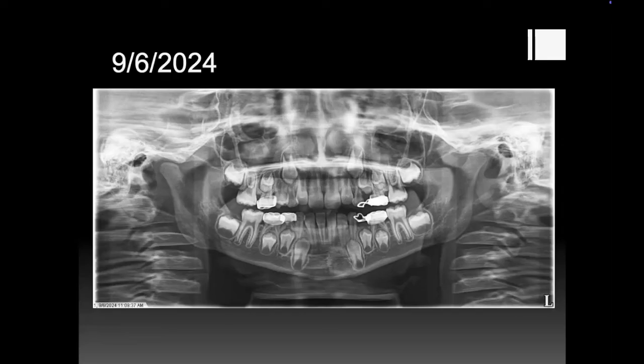The second primary molars are still there. They seem to have at least a little bit of root left. So that's good. And then we have primary canines, right? And they have a little bit of root left as well. I would have loved to have seen this patient 2 years ago and treated them then, because you would have had more solid baby tooth roots and your anchorage would be better and the resistance of the maxillary suture would be less. The older you get, the more interdigitated the maxillary suture becomes.